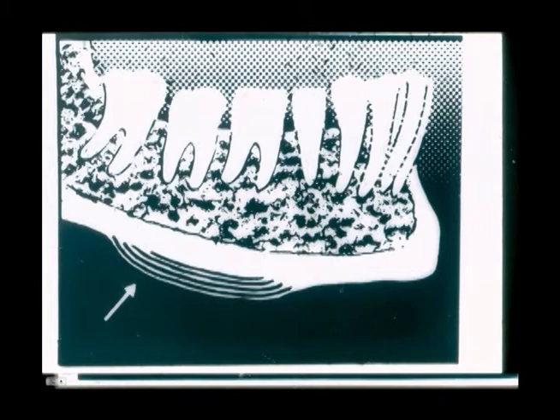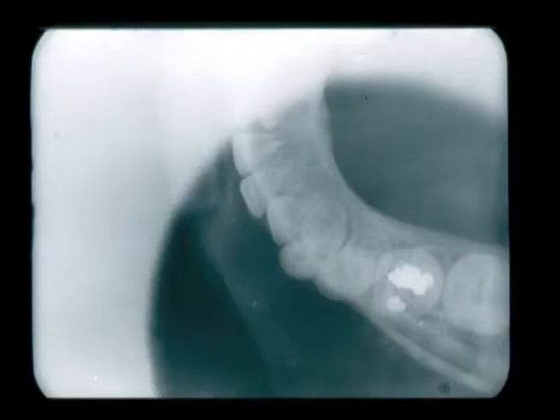This reaction can be long-term and is sometimes referred to as an onion skin appearance, a number of periosteal reactions occurring from a long-standing chronic infection. Here we see a periapical of an area where a tooth has been removed, a chronic infection has set up, and some bone sequestra can be seen in the radiolucent area. In an occlusal film taken of this area, one can easily see the periosteal reaction that is occurring on the buccal plate of bone. This buccal plate is often the first indicator of the periosteal reaction.